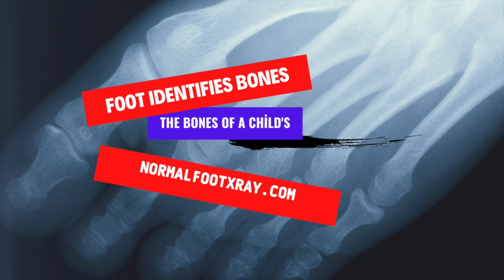A foot X-ray is a very important diagnostic tool for the diagnosis of fractures in the feet. It can be used to check for broken bones after an accident or to diagnose medical conditions. This scan uses a small amount of radiation and is completely safe. This type of X-ray can be interpreted by a physician without the need for specialized training. However, a medical professional should always perform a proper X-ray to diagnose injuries.